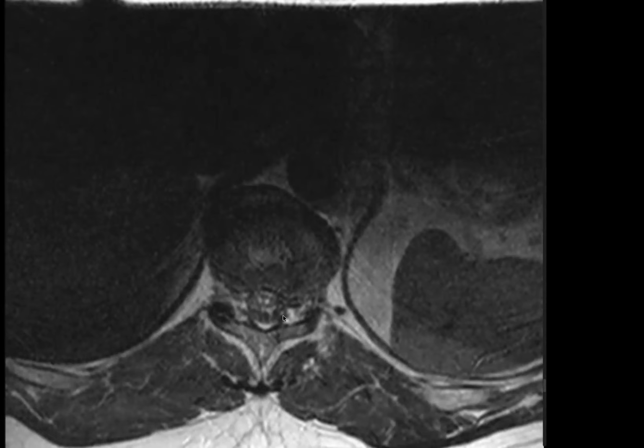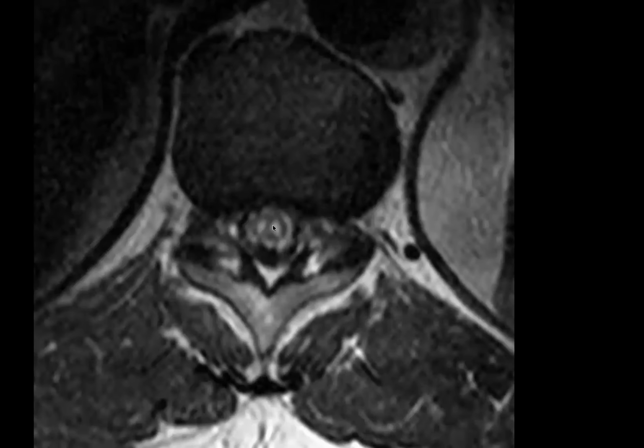Your first differential is acute cord infarct, which you thought of, and then you went with transverse myelitis. It could present like this. I'm not saying it's impossible, but you usually see a slightly different pattern of involvement of the cord. It's more confluent. It's more present throughout the cord, or maybe eccentric, central. But it's never this characteristic two dots bilaterally. Here you can see it better.